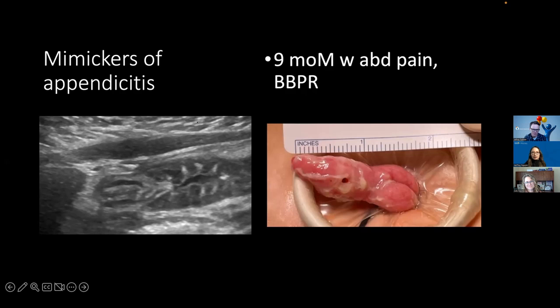Surprisingly, they had prior CTs and nuclear medicine studies, and I guess because there was no gastric mucosa or any other findings, it wasn't picked up. And once again, with CTs in a 9-month-old, it's really hard to even see the appendix. So I think we can diagnose more than just appendicitis. If you see other blind ending tubular structures or other abnormal little outpouchings in the right clinical context, you can definitely prospectively suggest Meckel's diverticulum or diverticulitis, or something along those lines.